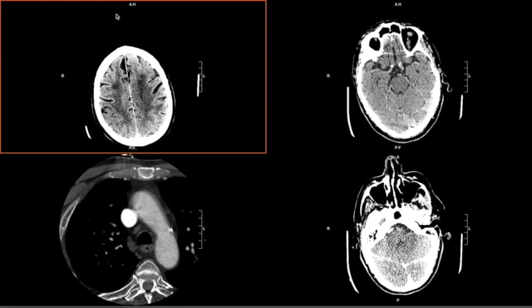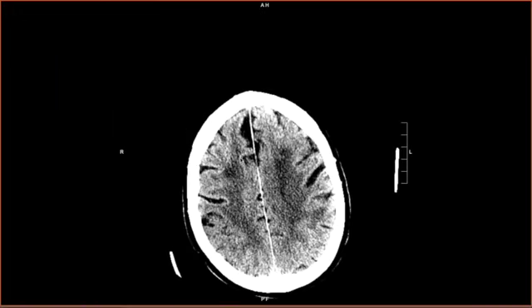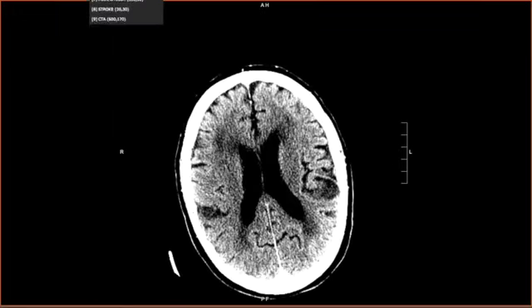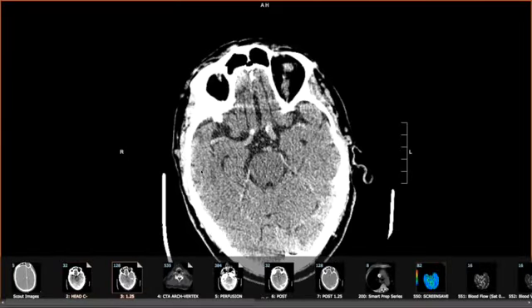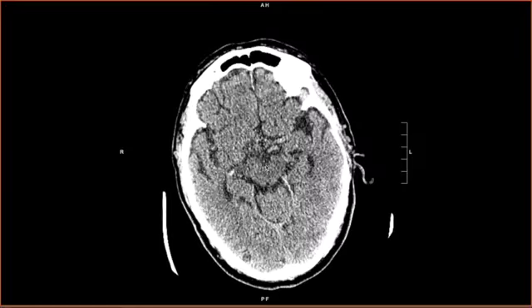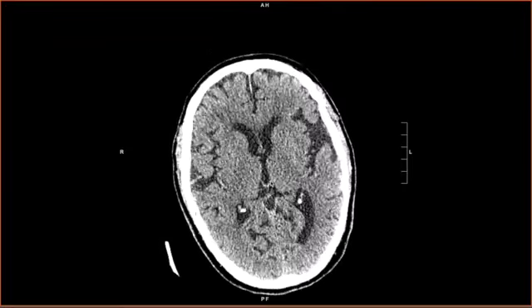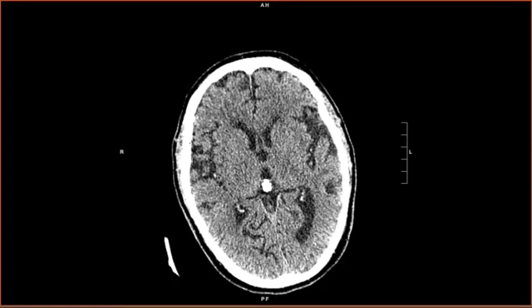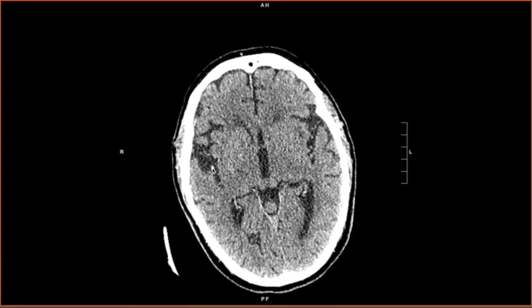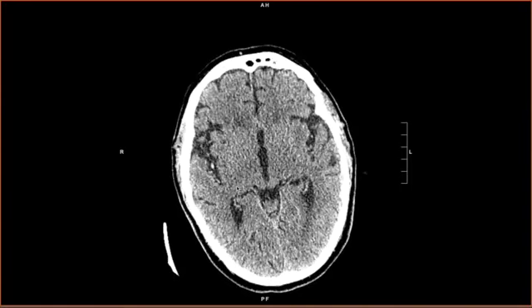It also demonstrates the point that the hyperdense vessel can often be very subtle. So you don't really see it here on the thick slices. But when you put it on thin slices, this is again a non-contrast, but in thin slices, and we look at the M2 branches in this area here, you actually see a hyperdense vessel here. Compare this with the other side. This is a hyperdense vessel that was not well appreciated in thick slices. So sometimes you can pull up the thin slices to look for it. But again, this is a subtle case.